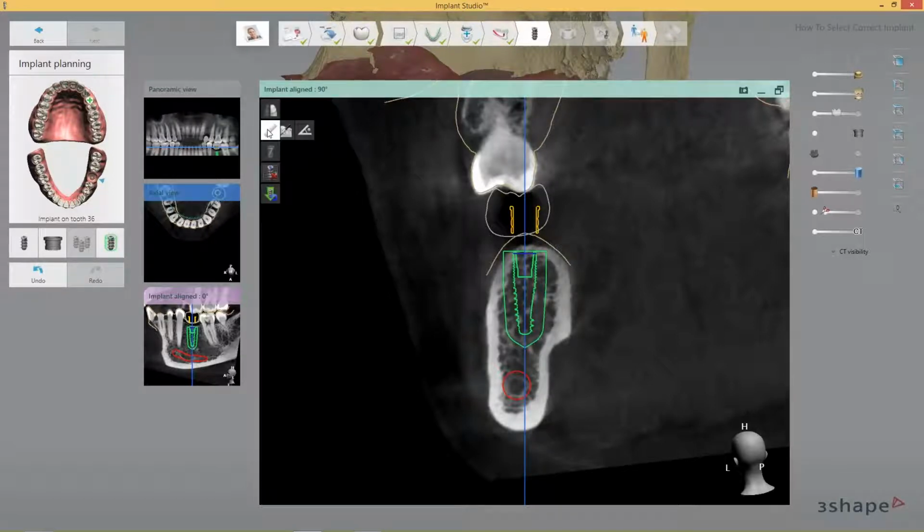What I also have here is, of course, the possibility to measure something else. It's the bone density and the quality of the bone. So if we look at a position here in the middle where we have the extracted tooth being the alveolar, actually, we have as low as 60 Hounsfields. So this is almost air. It's very, very empty. And at the sides, of course, we have 1,400. So this is stone hard. It's really, really bone hard.